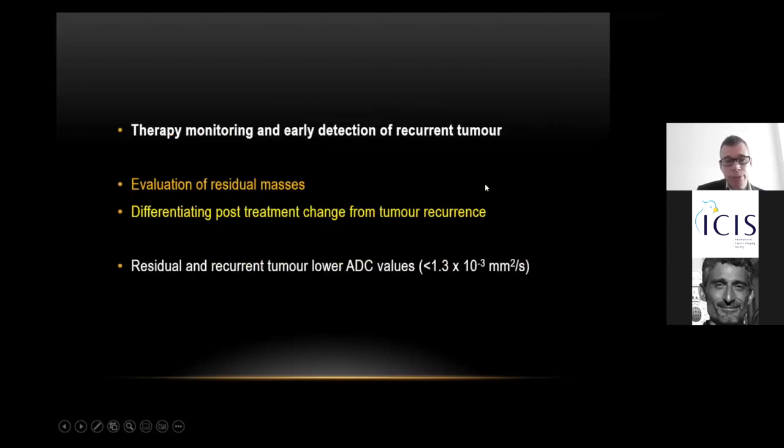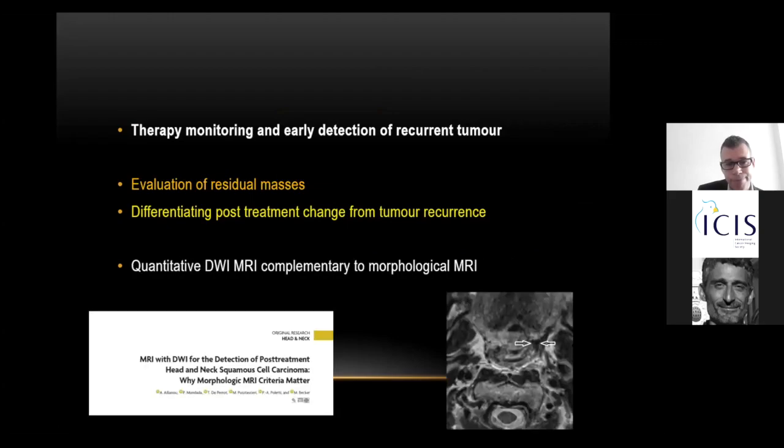Finally, differentiating post-treatment change. And here we have again been given thresholds to potentially distinguish post-treatment effects and fibrosis from those due to recurrent tumor. This is absolutely key in this situation that we correlate with the structural imaging for several reasons.